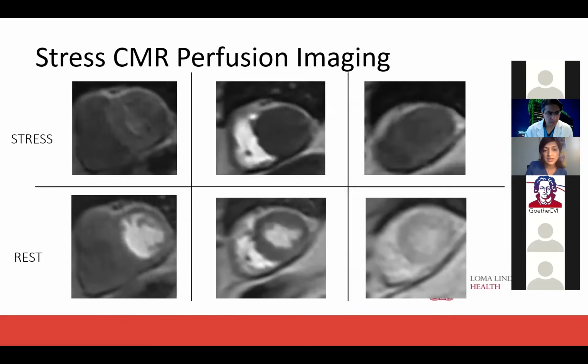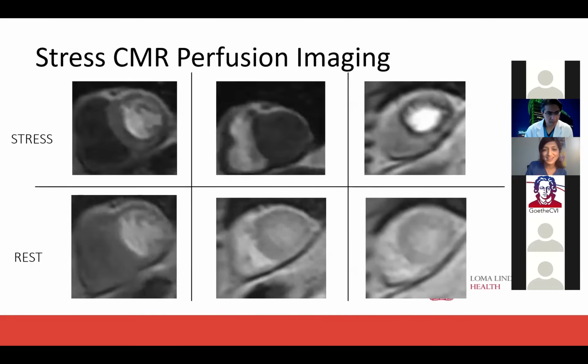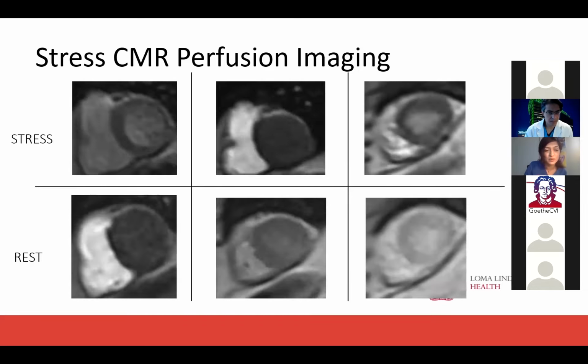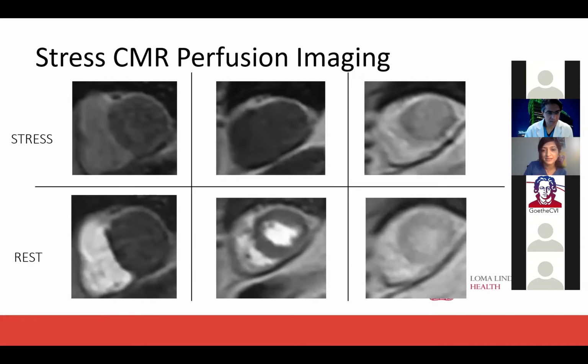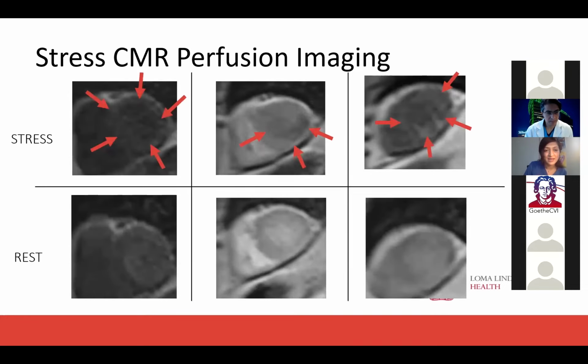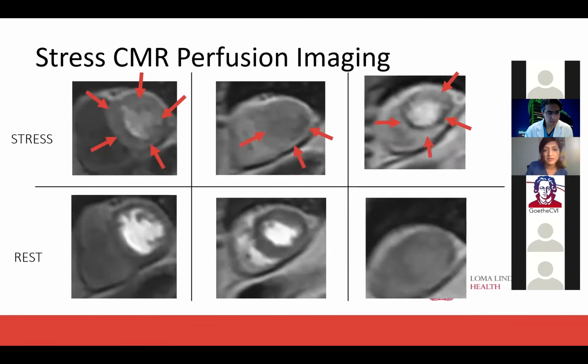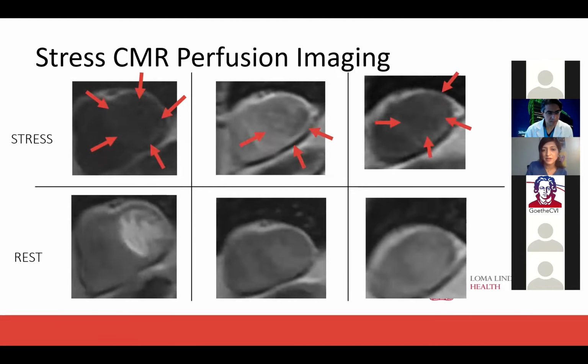So I know this can be a bit overwhelming while presenting in the webinar and looking at 6 slides together. So if we go next slide, please, Ryan. And then let it play. Hit next again. Yeah, so I hope that everyone can now appreciate the defects that are seen.